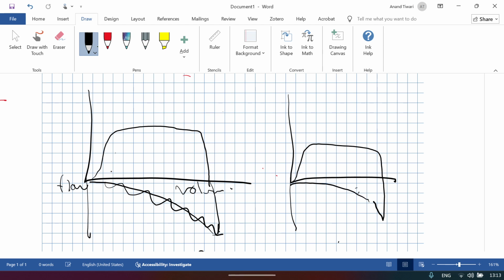Normally it should come like this, but there is reduction in the peak flow. You give a bronchodilator and you get a normal peak flow touching the baseline. That depicts the increase in airway resistance. So you can easily pick up the resistance problem in the form of this scooping pattern and reduction in peak expiratory flow.